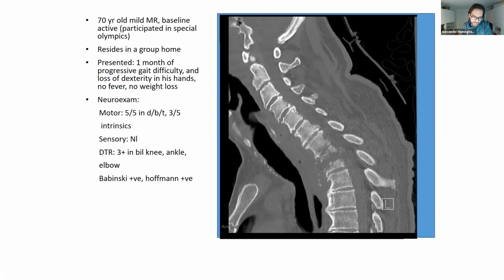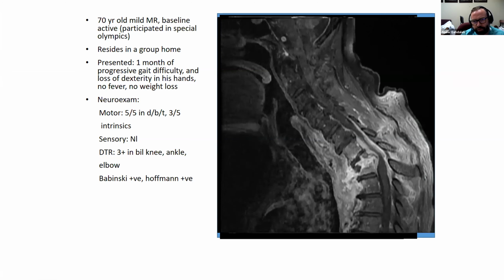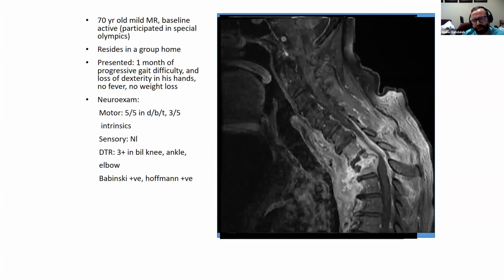And I wonder what the blood sample is telling us? The blood sample, excellent question. I'll hold off. I'm going to show the images first because I'll give it away right away. Good for you. So this is actually a destructive process, T1, T2, and this is the MRI, T2 sagittal view, and this is with contrast. Let's look at the contrast one. What do you guys think?